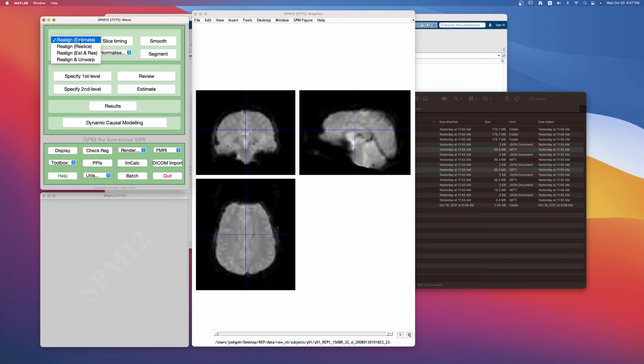So if you run it, and then you don't notice it, and then the next time you think it's the same file, and you run it again because you forgot that you ran it before, that would be a big error. Because it's already been estimated, when you run it again, it will re-estimate it again, and that might have the potential of messing things up. So it's important that you realize that when you run an estimate and the name doesn't change, that doesn't mean the file is the same, all right?